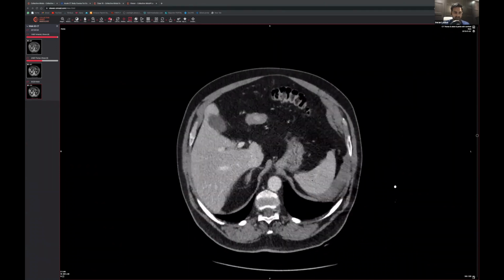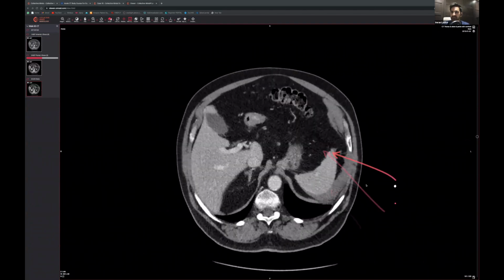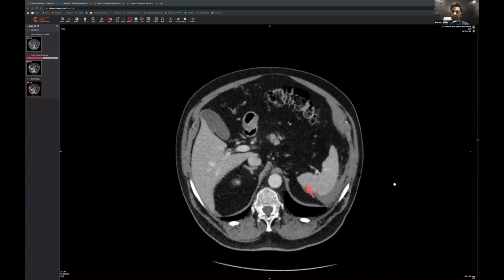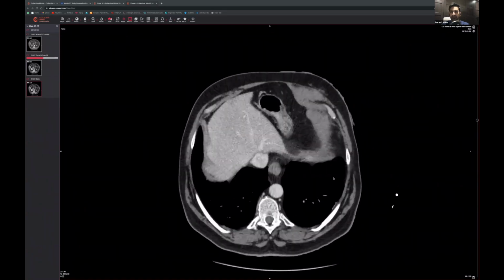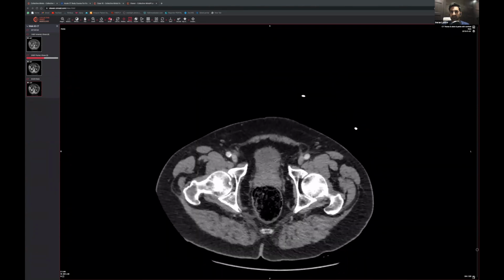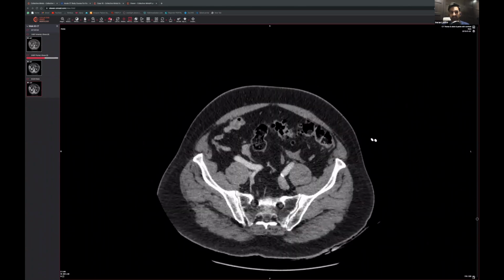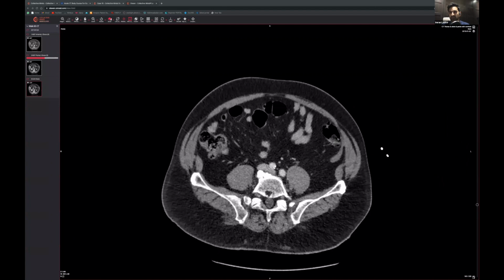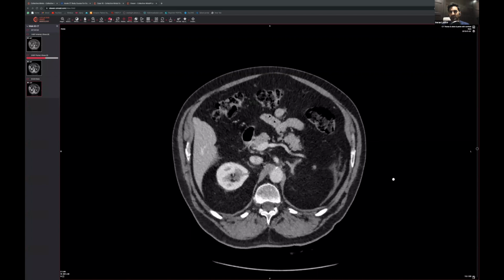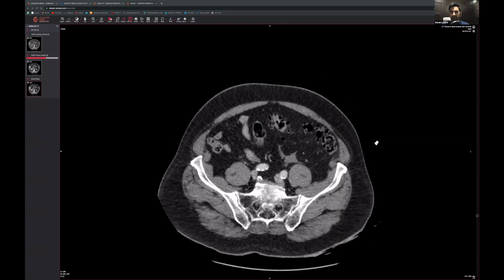Have they had a laceration of the spleen? Have they been stabbed somewhere this way? So you're looking for stab wounds that way. Can't really see much. How else could they have a low density area over there? It's possible, but I just can't see where that stab wound would have happened. Bowel-wise, bowel looks okay. Let's follow along. Some diverticulosis, but no diverticulitis. Coming up all the way across, we're going okay still. Doesn't look like there's any laceration, perforation, or anything like that.